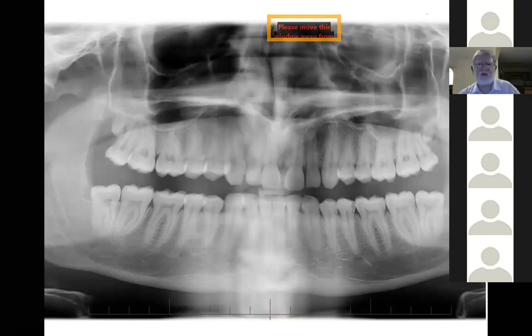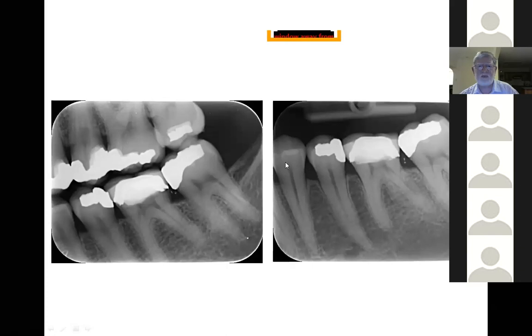Okay, let's have a look at teeth here. What's going on in this patient? Supernumerary distomolar 1-8 and 2-8. Okay, yeah, so extra tooth there, good. And the reason for this picture was to show up an additional root across there, towards the lingual of that, or distal of the 3-6.